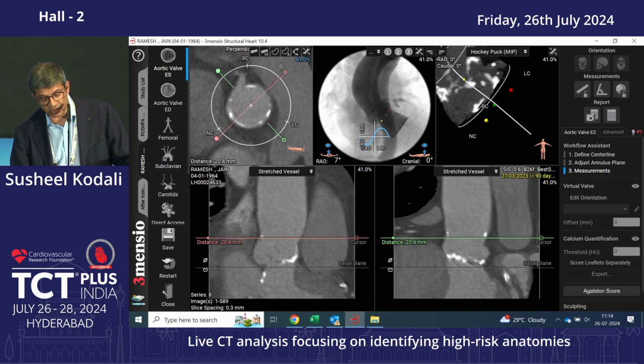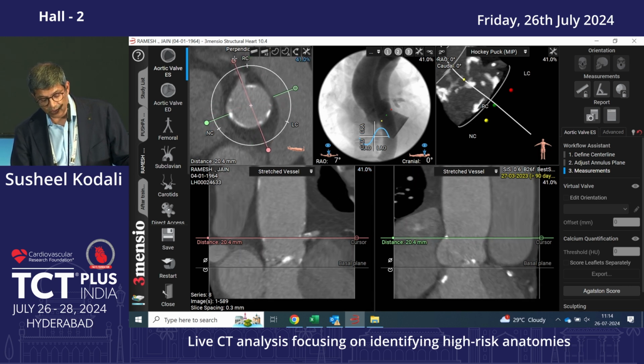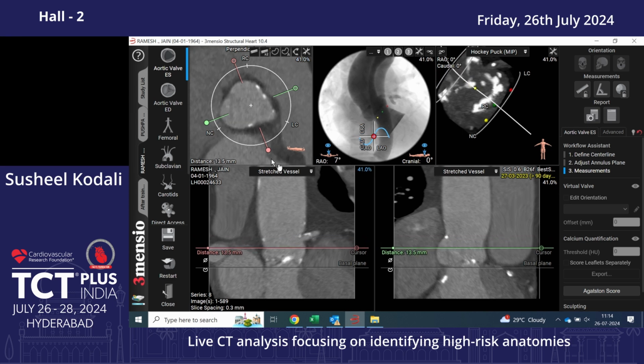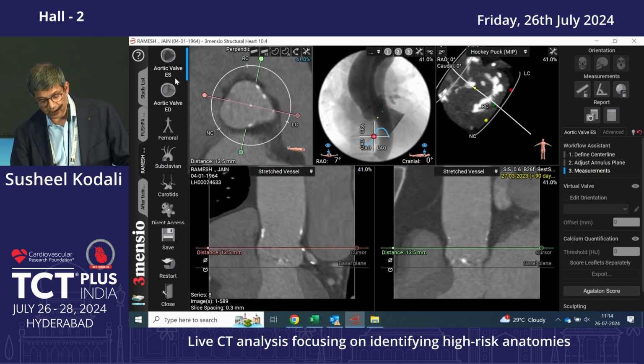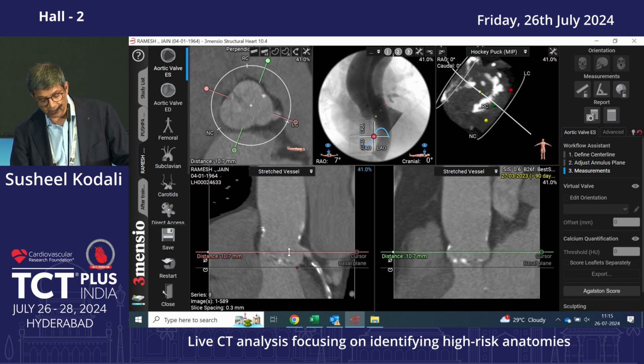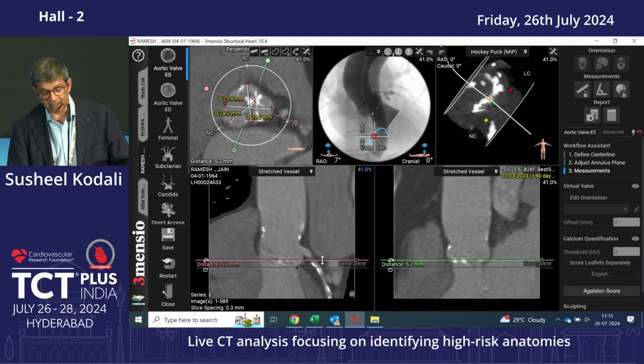The right coronary comes off at the STJ, so no risk of the coronary impeding the right. The left here comes off high as well, as you see, at around 13. I scroll down, the bottom of it is around 11. So, a relatively large sinus, the coronaries are high, and there's a calcified raphe, but not terribly calcified.